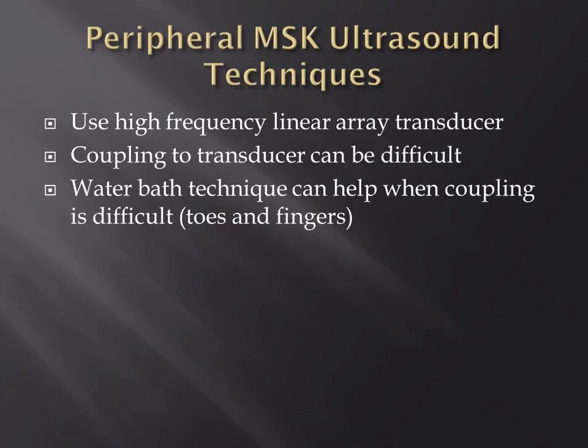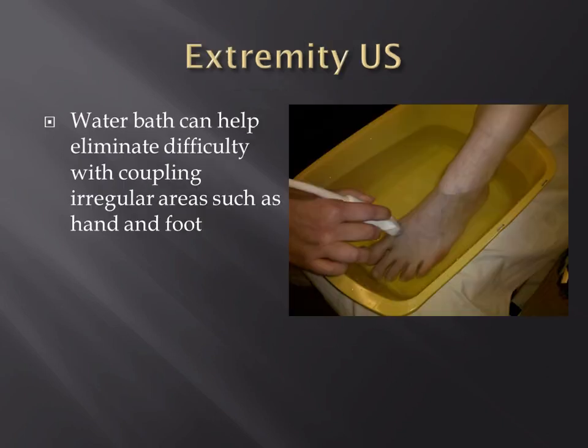So again, high frequency linear array transducer, very beneficial in the extremities, hands, fingers, toes. Now, I mentioned here a water bath technique. It can help when you've got difficult surfaces that are hard to couple. And I'm actually surprised that this technique has not come up thus far in this lecture. It actually makes me a little bit nervous that maybe some of you out there that do more of this than some of us know something about this technique that I don't. But I find it very, very helpful in the toes and the fingers.